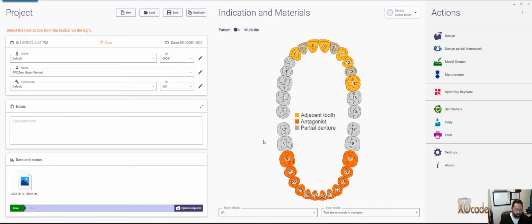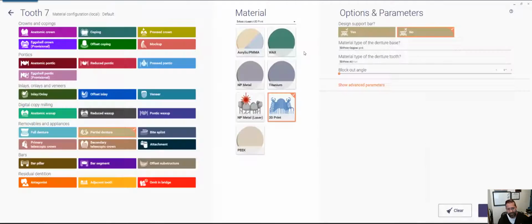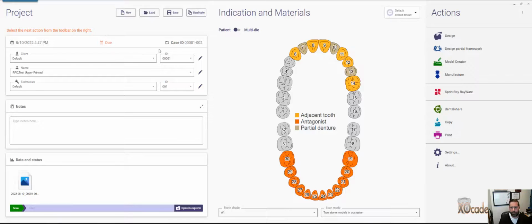one tooth, Nesbit partials, spider partials, whatever you want to call them. And I'm going to show you a different way than maybe what you've seen, because how I was doing it before was I would hit the teeth that are missing, and in this person they're congenitally missing 7 and 10, and then number 13 was extracted.